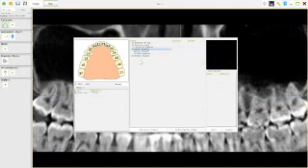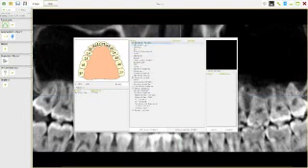If I go onto there, we can look at some other implant ones here. We've got Southern implants. So it gives you a whole range of different implants that you can use and the different codes. And this is just a library of implants that are there for you to use. And then we've got our standard implants as well.